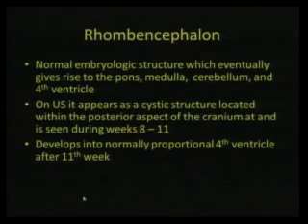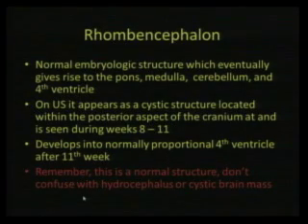And so again, you can see the importance of accurate dating, as far as when the mom's last menstrual period was, to determine some of the things we're about to talk about. Dates are very important, and you want that date to be as accurate as possible so you know if these structures that we're seeing are actually normal or something abnormal. Remember, during this time frame this is a normal structure, so we don't want to confuse it with a hydrocephalus or a cystic brain mass.